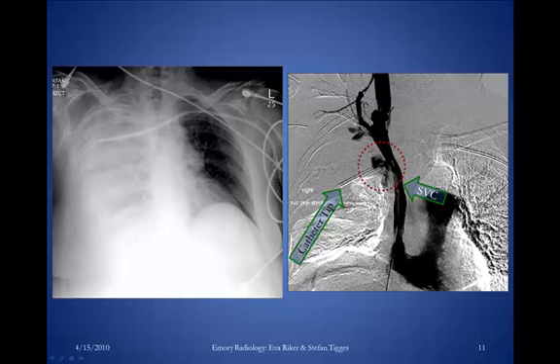And this person ended up getting an arteriogram, I'm sorry, a venogram, superior vena cava gram. SVC is marked there on the image there on the right. I've also marked the catheter tip, and circled is some hemorrhage. So basically what's happening here is that we have perforated the SVC and we've got hemorrhage into the right hemithorax. And that's what all that white stuff is in the right hemithorax. That's all blood. That's a big hemothorax there from having perforated the SVC because of this line malposition.